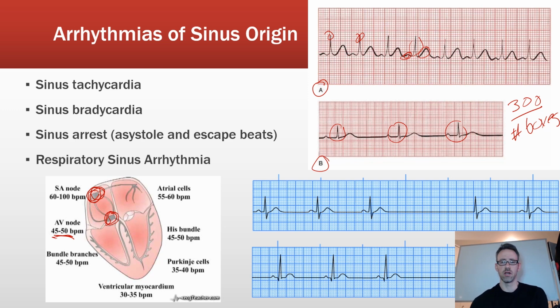And so you can see here, we have 3 beats. Take a look at the example over here. All right, you have 3 regular beats, and then there's this long pause right here. Okay, there's a long pause.